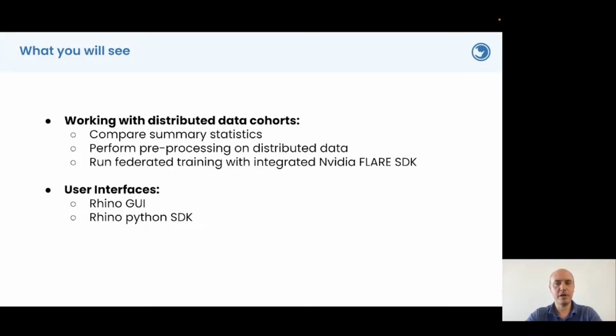A few things I'm going to cover in this video. I'm going to show you how you can use the Rhino Health platform to work on distributed data sets or data cohorts that can sit behind the firewalls at different healthcare institutions. I'll show you how you can compare summary statistics across these cohorts, run customizable code, and run federated training using NVIDIA's Flare SDK. I'll also cover a few different user interfaces, including our graphical user interface and our Python SDK. So let's get to it.